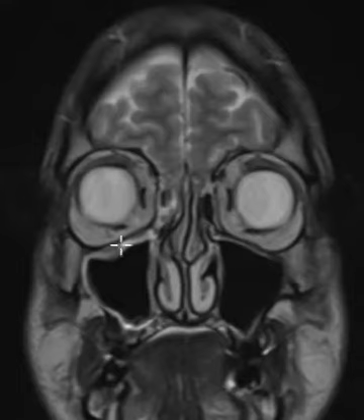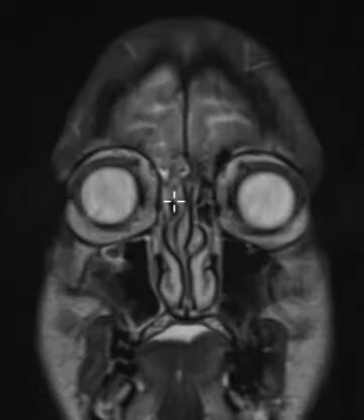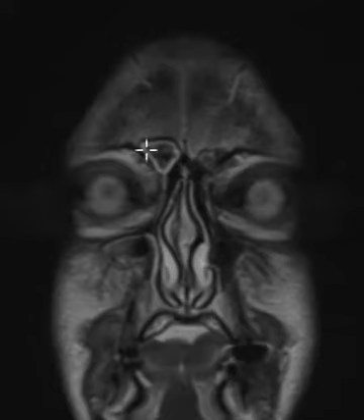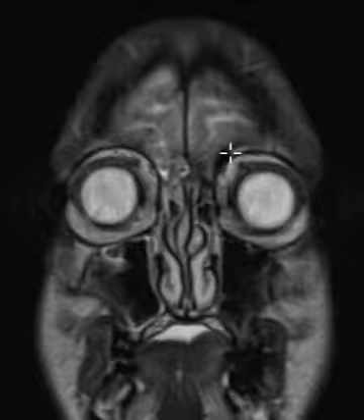So this is the right maxillary sinus, and it communicates with the next sinus here. This is the right ethmoid sinus. And that one goes up and communicates with this right frontal sinus. And in this patient, they have a congenital anatomic variant where they just don't have a left frontal sinus. They just have a right small one. Sometimes there's no frontal sinus. It's a pretty common normal anatomic variant.